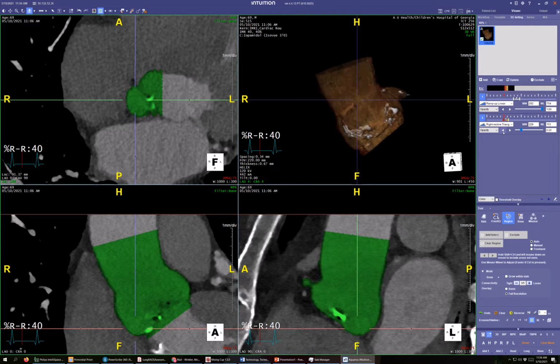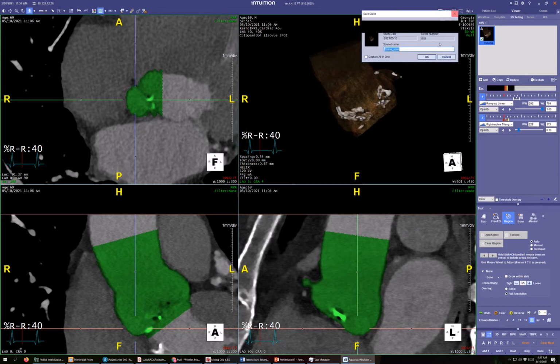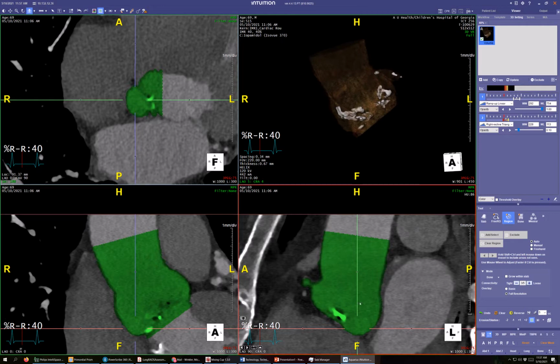Still not super happy. Let's just do this. Let's, yeah, there we go. Okay, so hit X. Gives you a good sense of where everything is, right? And we'll take a picture of that. And we'll click this little box with the cross in it to save our work.